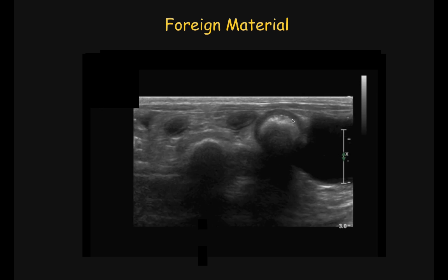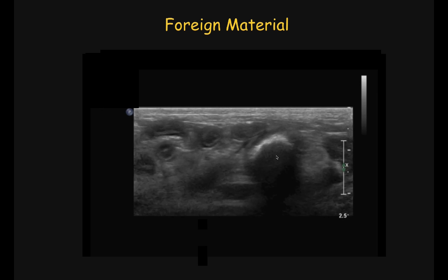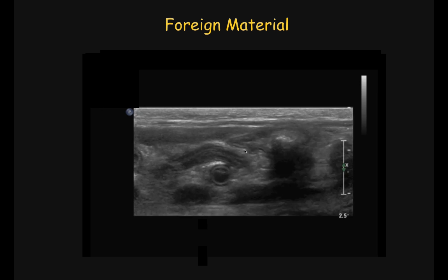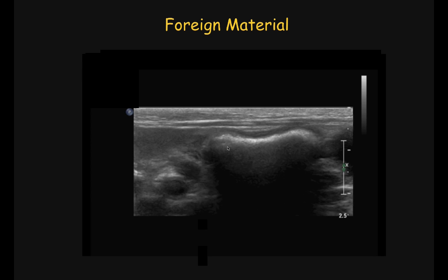And then we finally reach that curvy, linear, bright interface associated with strong, clean shadowing, and right after, the bowel segment returns to a normal diameter. The shape of this foreign body is actually suggestive of a hairball, and in this case it's an obstructive foreign body as we had fluid accumulation oral to it. This was confirmed at surgery.